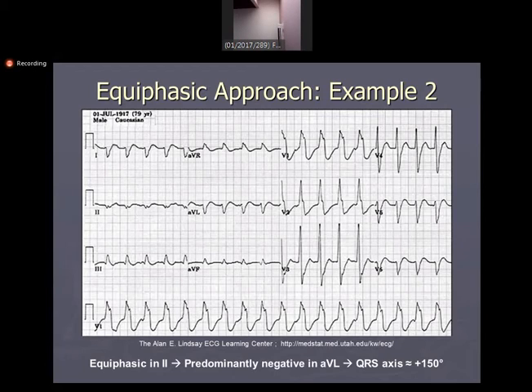If you calculate heart rate like this, take a 6-second strip of 30 large boxes from here to here. This is 30 large boxes. In 1 second, 5 boxes; in 6 seconds, 30 boxes. Count the QRS complexes and multiply by 10. You can easily get the heart rate.